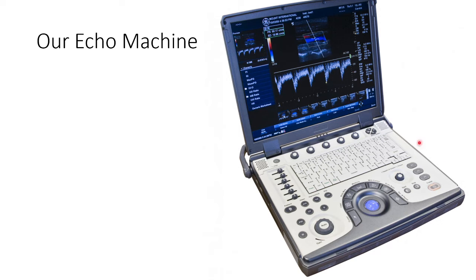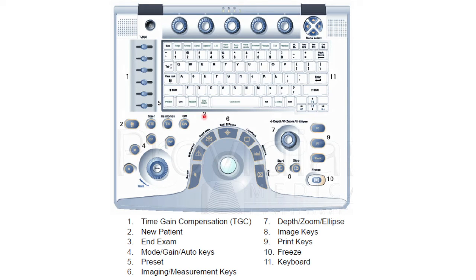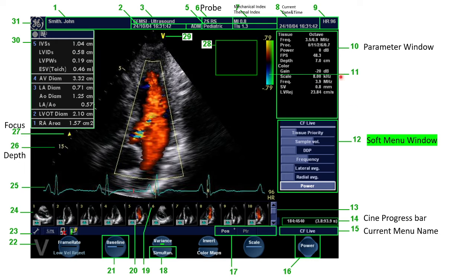This is the echo machine which we use in our CCU. It's a GE called Vivid E. This is the front panel, and I'll be discussing each and every knob, what it stands for, and how we can optimize it. This is the main screen of the echo machine, and this is the logo.